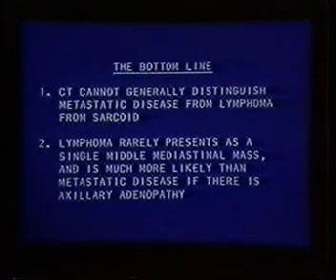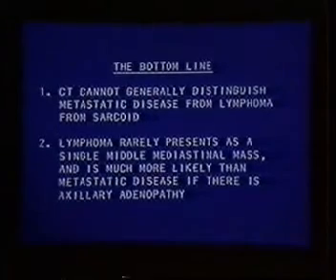One is that lymphoma very rarely presented as a single middle mediastinal mass. So since that was the most common thing on the list, if that was your morphology, I think you could pretty well eliminate lymphoma. And also lymphoma was a lot more likely than metastatic disease if it turned out that there was concurrent axillary adenopathy.